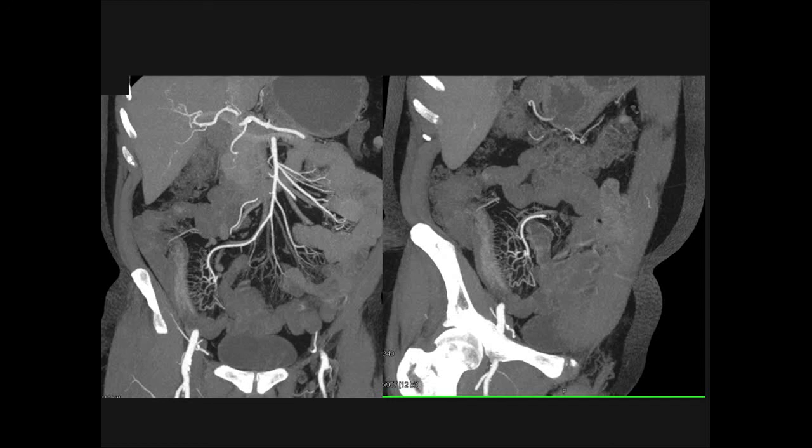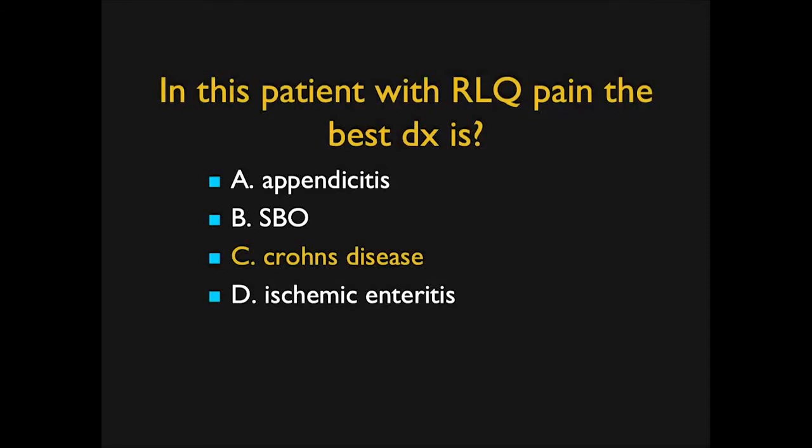Crohn's disease is classic for comb sign. You can see the comb sign at times with other things, GVH or other inflammatory processes. The enhancement of the bowel, again, great for Crohn's, though not specific. But together, I think it's Crohn's disease, and Crohn's is the answer.